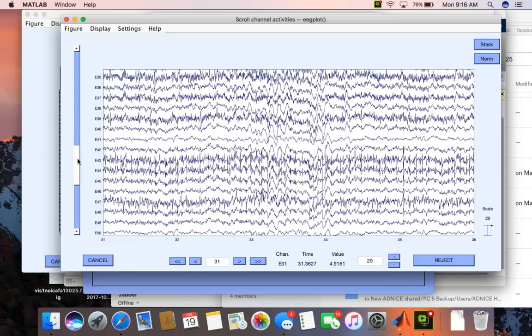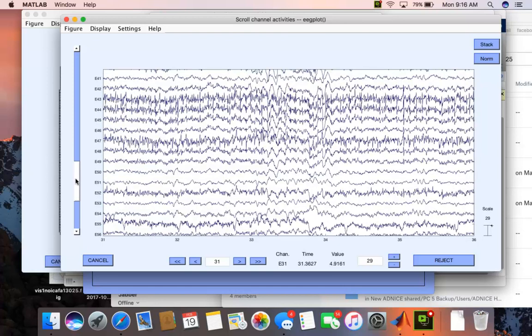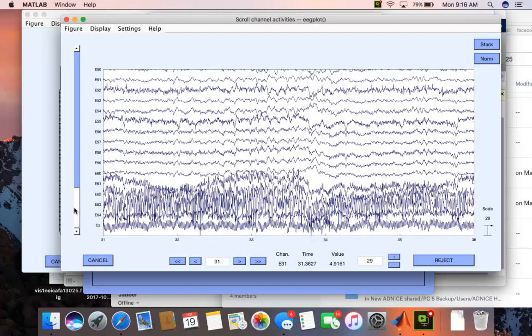So unlike a lot of the data that you're creating in class and that the textbook author is having you create, you can see that when you actually start to look at a real biomedical data set, things get very, very messy. All right, in this instrument, the bottom 5 channels have a specific use and application, and they're not really quite related to EEG.